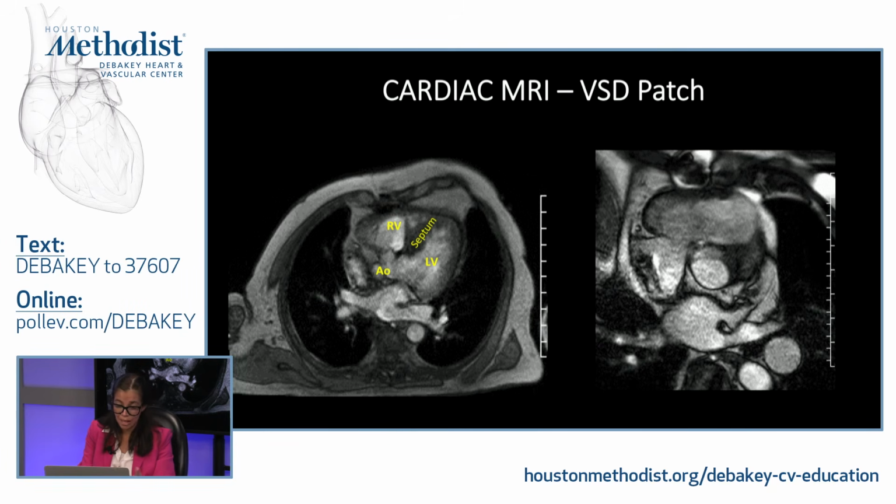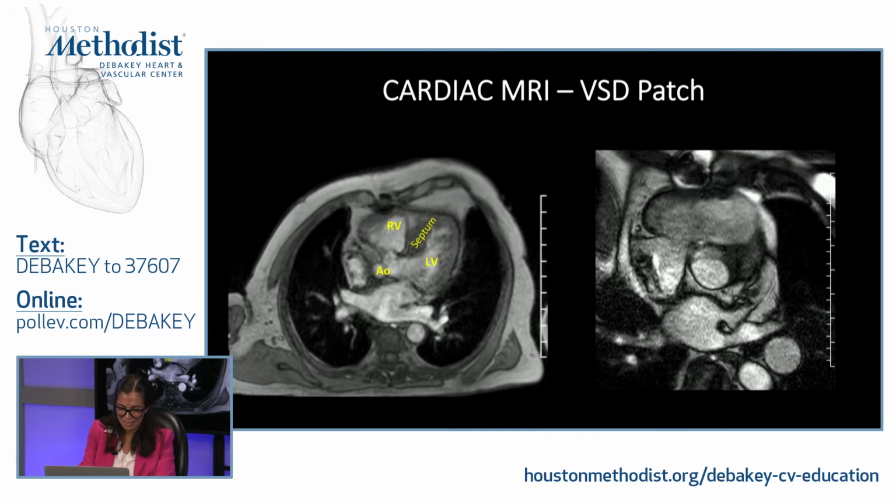And then the other thing that they do in the repair is the VSD patch repair. I have seen many patients with tetralogy of Fallot. I also do this for research. And it's very infrequent to find a residual VSD. It's not a frequent thing to find residual VSDs in these patients. But I've seen some, and this one in particular was significant.